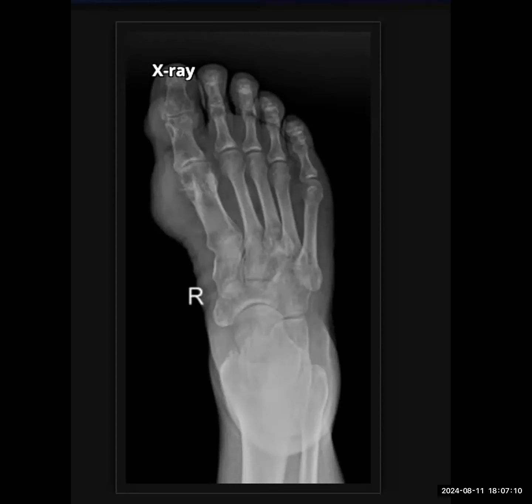If I tell you that my concern is that there is a soft tissue hyper radiopacity, and I think it's calcium versus gout. So what kind of crystals do you see in gout? Sodium urate crystals. Okay. So how do you differentiate between monosodium urate crystals and calcium? What investigation can I do to differentiate between them?